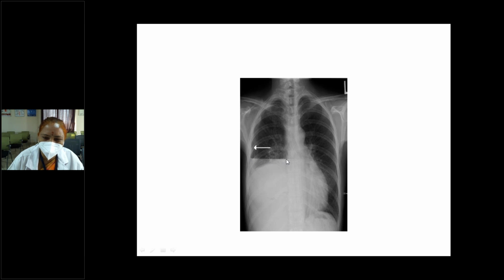Whenever there is a clear horizontal line in the chest X-ray, below is the haziness, above is the translucency. So, yes. What do you think? So, this is a clear-cut air fluid level. Fluid below and air above. Horizontal air fluid level indicates hydropneumothorax or pyopneumothorax. Same as the previous X-ray? That is a different person. This is a different person. But other findings you should not forget.